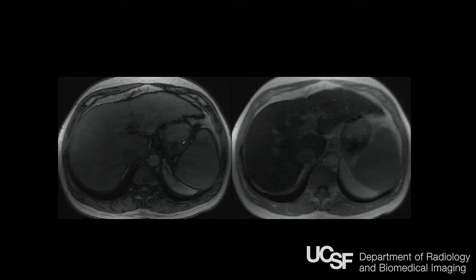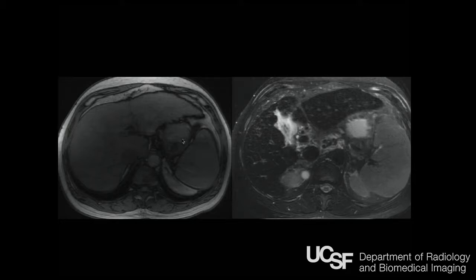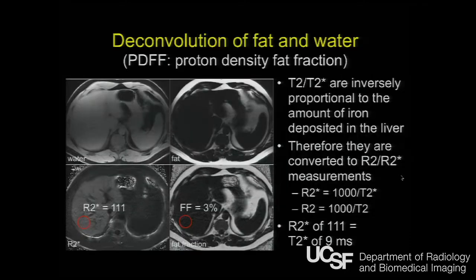primary hemochromatosis, right? When you have iron transfusion, hemosiderosis, you'll have reticular endothelial system biodistribution, so the spleen will become dark as well. So here again, you can see the liver's dark on T2 weighted imaging as well. The spleen is not dark, again, primary hemochromatosis. Don't go through this slide in too much detail. It's important to remember that fat and iron have opposite effects on in and out of phase imaging, which makes measurement of fat content in the liver very inaccurate using in and out of phase imaging.